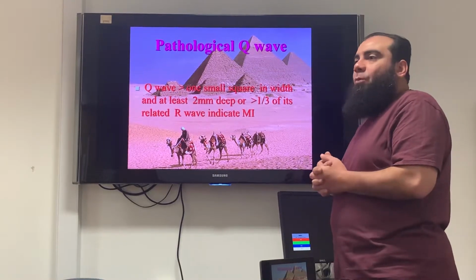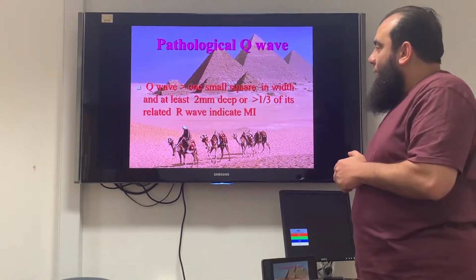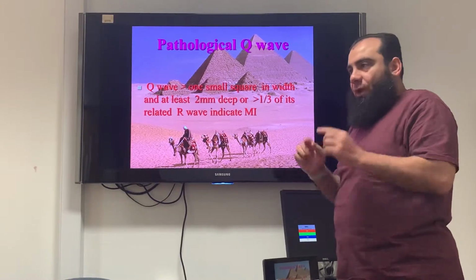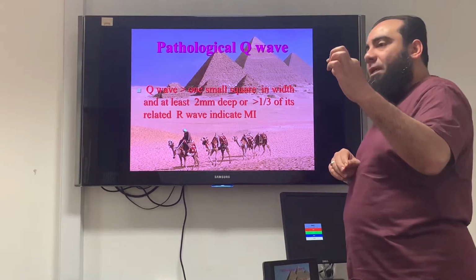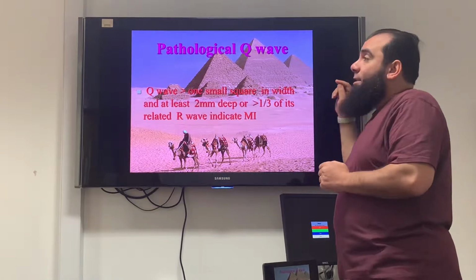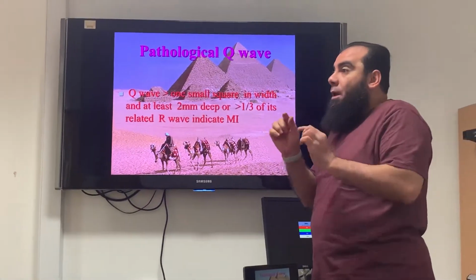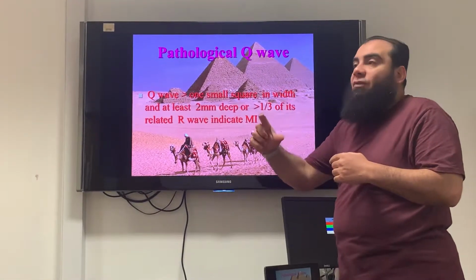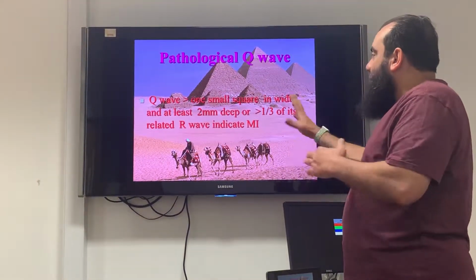So today we are going to speak about one wave itself: the Q wave, one of the most important waves in the complex. The complex is QRS. The Q wave normally is supposed to be less than one small square in width, and not more than two small squares in depth, except in lead 3, which has a normal variation of up to a small square wide and up to 7 small squares deep, perhaps. But otherwise this criteria fits.